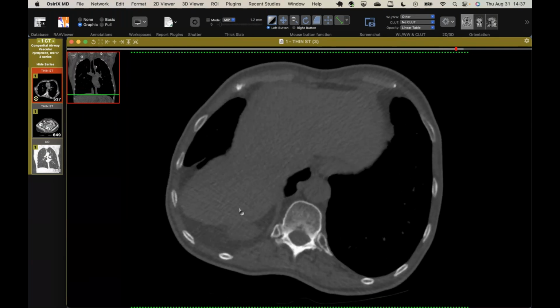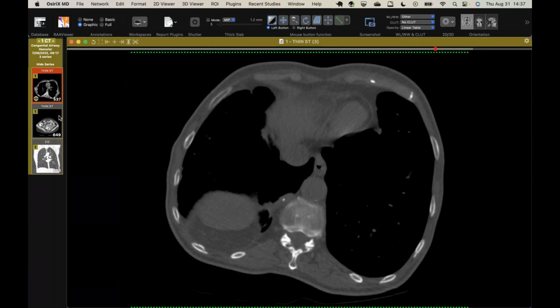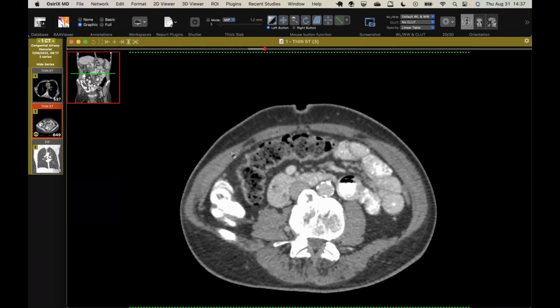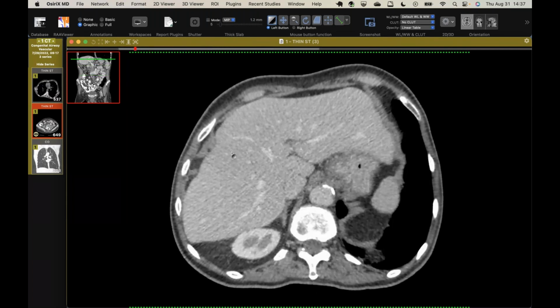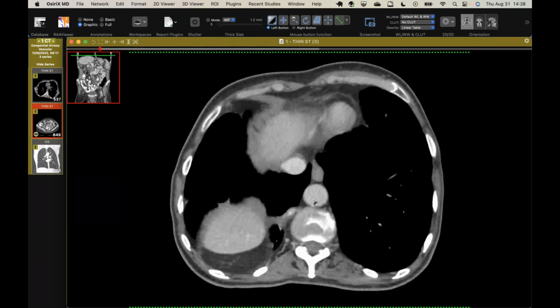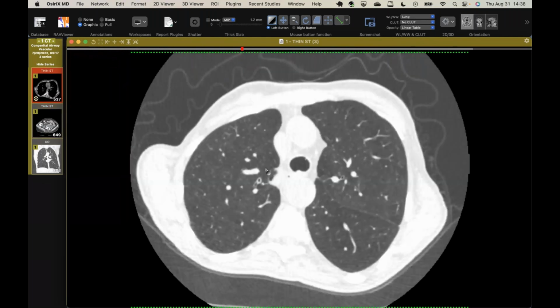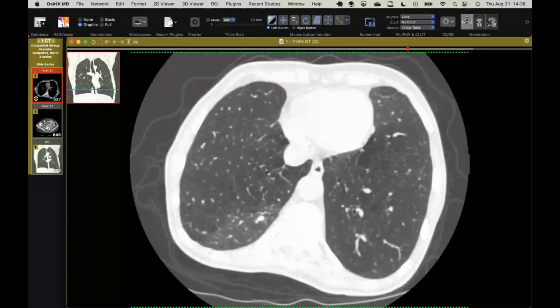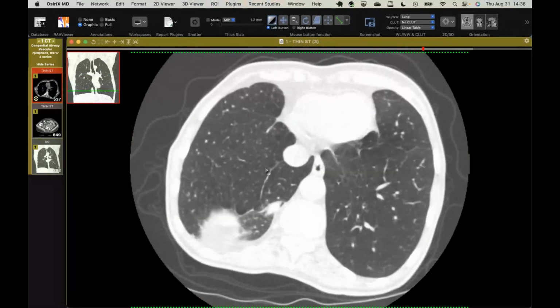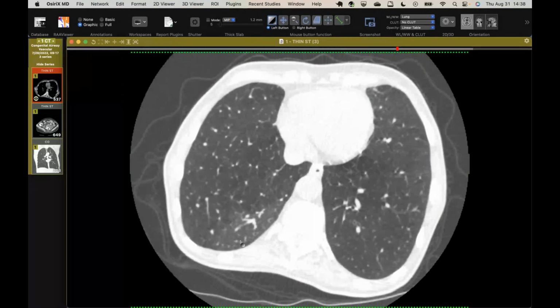And you can see it looks like it's trying to come from the aorta here. There happened to be an old abdominal CT that confirms that this is indeed a systemic artery coming off the aorta and sliding into the right lower lobe. So you might think about sequestration because we have systemic arterial supply, but if you look at the lung parenchyma, there's no sequestered lung. It's just hyperperfused. So this is just systemic arterial supply of the lung.